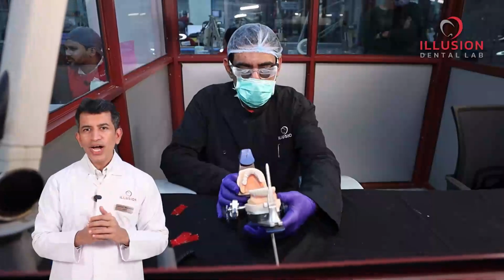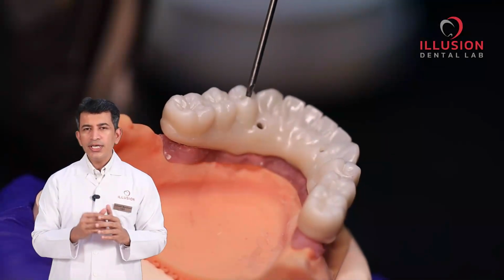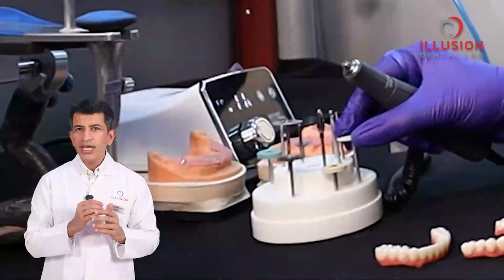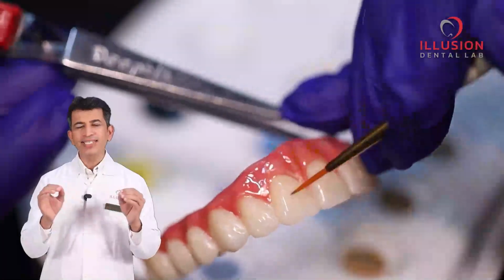Compared to PFM, zirconia offers fewer steps, greater reliability, and superior aesthetics. The assembly of iBAR plus prosthesis is checked for an overall fit, screw channel accuracy, margins, and occlusion. Margins are refined with ultra-fine diamond tools. The zirconia is polished with special kits, and natural surface texture is created for lifelike aesthetics.